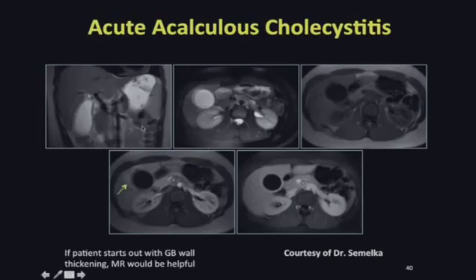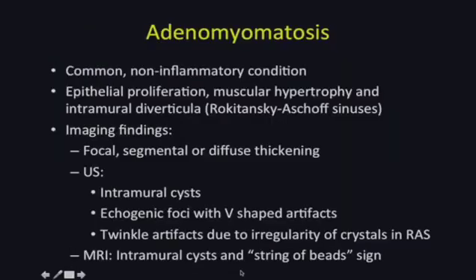We see in this patient gallbladder luminal distension, this beautiful T2-weighted double-layered gallbladder wall edema, and smooth sludge. The contrast-enhanced study early shows the adjacent hyperemic vascularity of the liver parenchyma adjacent to the gallbladder, a very helpful sign for acute inflammation. And here we see smooth mucosal wall enhancement of this gallbladder, which is consistent with acalculous cholecystitis.